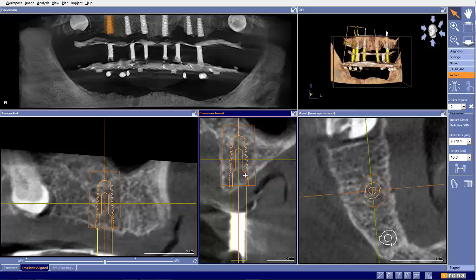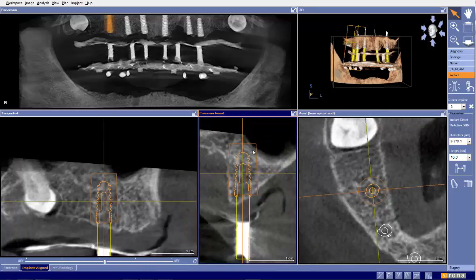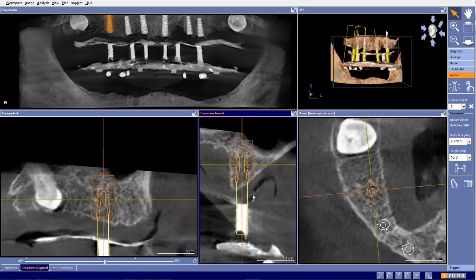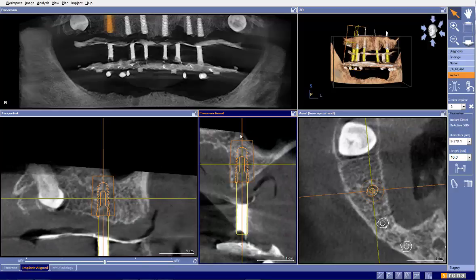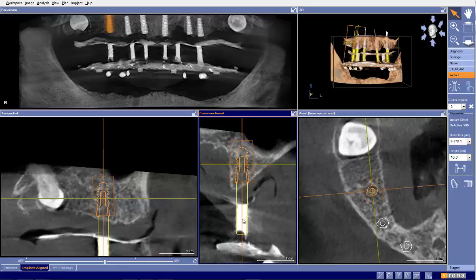And what I would like to do in an ideal world is probably go ahead and bury that a little bit. At the time of surgery, go ahead and flatten this out to create a nicer ridge profile, also to prevent any implant showing, especially given the data that we have here. Again, this could change based on where these final teeth are actually going to be. We may actually end up tilting like that. It really just depends on where these final teeth are going to be, and I have no way of knowing that that is the proper position.